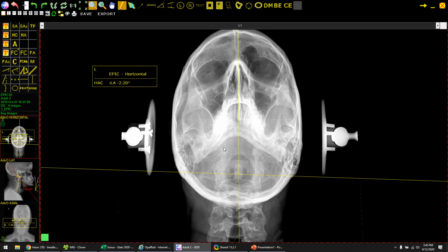This will be a great selling point for you guys, because you can cut out a lot of the extra stuff and get a nice oval, without all the extra weird stuff going on. And also you'd be able to take out C2 on down. We're just really looking to see how C1 is in comparison to the skull. But if you guys can cut it even more and just have the condyles of the occiput, so like the foramen magnum and condyles to C1 and even C2, that would be a really good shot from your perspective to look straight down through that neural canal.